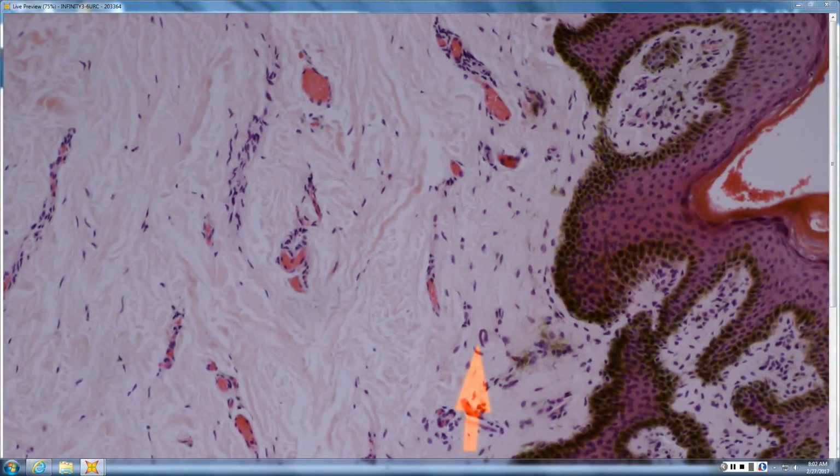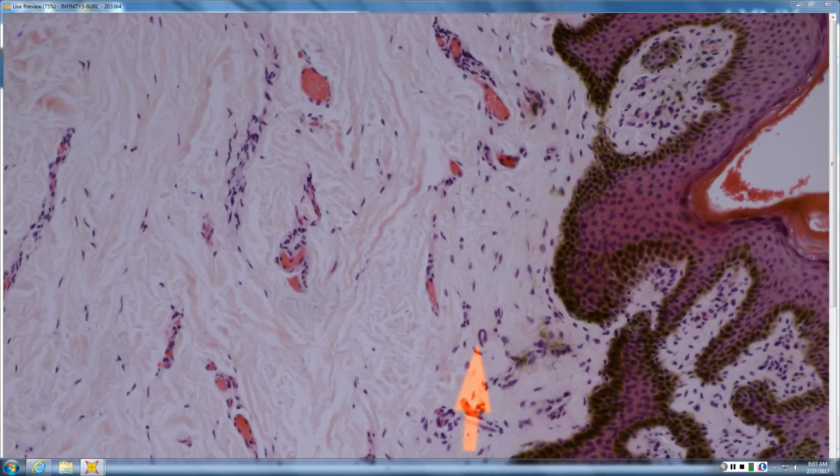So, elephantiasis, you've got a big worm lodged in the lymphatics. Microfilaria are called that because they are micro, right? So they are much smaller than the filarial worms. And as long as you get to this is microfilaria of some sort, then the next question becomes, does the patient need treatment? Do we have to prevent blindness? And you can enlist help to get someone to identify it.